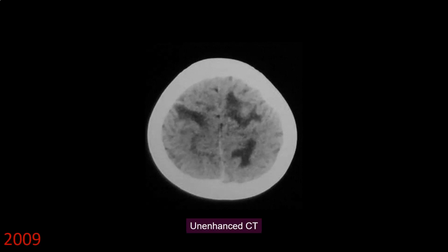This has been a well-known case of chronic granulomatous disease. Chronic granulomatous disease is a rare genetic disease in which phagocytes are defective, and therefore the body is quite vulnerable to bacterial and fungal infection. At the age of 6 years, this patient had brain lesions.